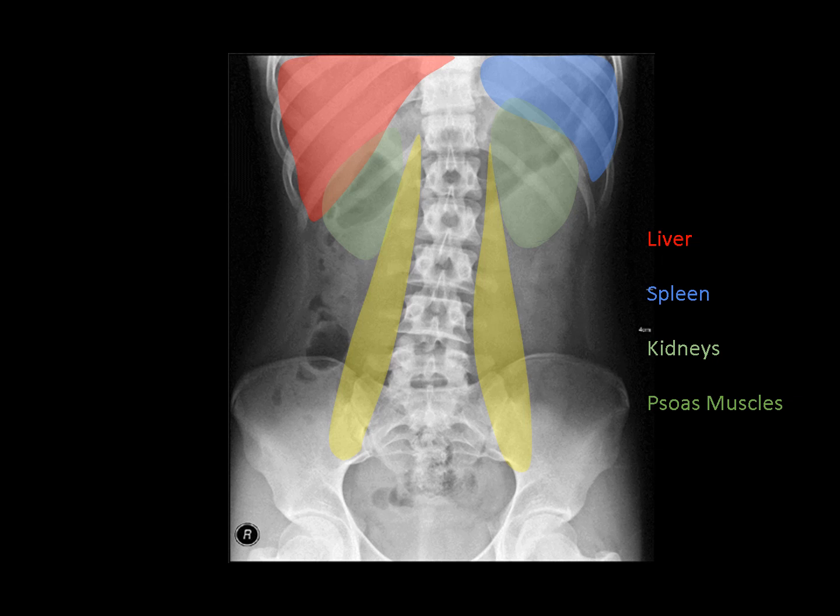It's rare that you'll see a pathology in the psoas muscles on radiograph, but it is good to know that they're there and to look out for them.